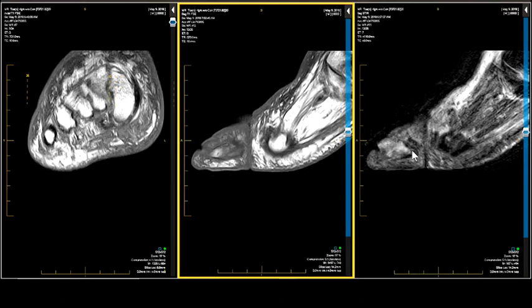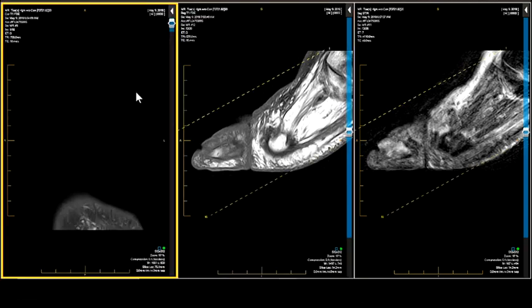And we said you can get edema from osteomyelitis on the water-weighted image, but it has to be on the T1. Otherwise, it's reactive. Otherwise, it's periostitis. Otherwise, it's non-invasive, non-penetrating disease. So let's see what he's got. Pretty simple. Let's check out the great toe. I'm not going to make anything fancy about it.